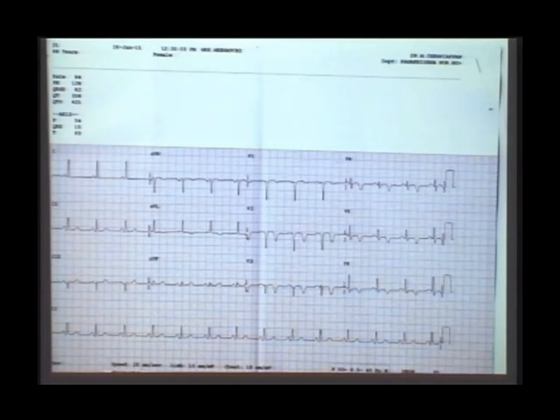And you see the ST there? ST is at the baseline. So there is no ST elevation here. That means this is a fully evolved subacute phase. Because you have treated the main aspect of the acute phase injury, you discharge the patient.